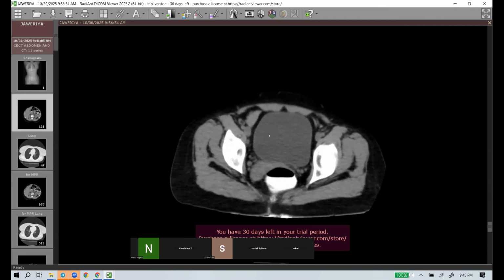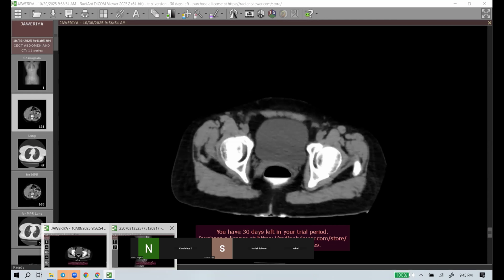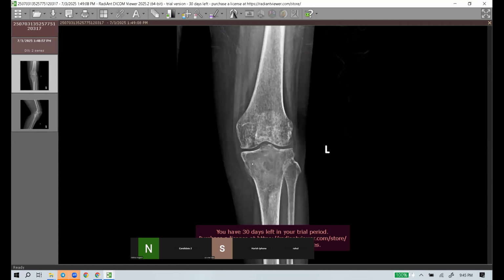Okay, sir. So that was the last case. You did well. So this was the second case. In the starting, you started with a lucent lesion in the proximal tibia, and you could have used the word I was waiting for you to use instead of proximal tibia, that it is epi and metaphyseal in location, and whether it is extending to the joint, matrix mineralization, and any pathological fracture. Then good that you immediately told that you want to see with orthogonal.